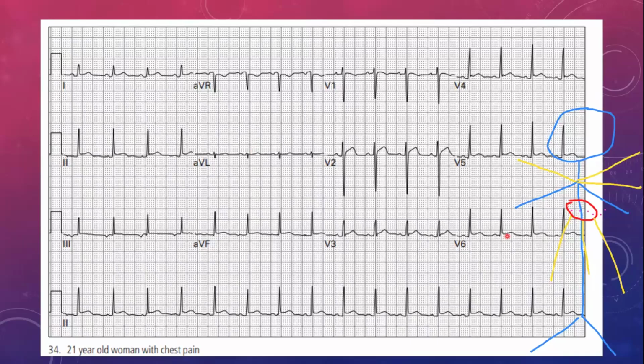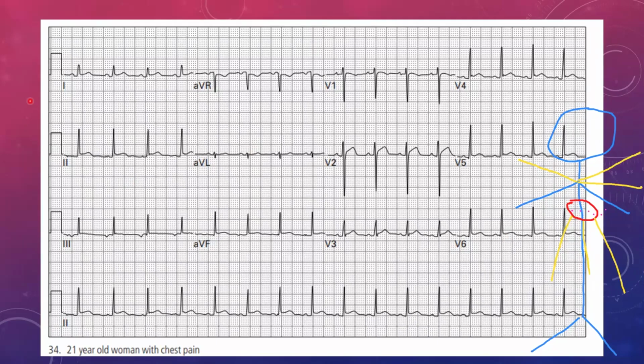Any ideas on what could be going on or what the possibility may be? It's okay if you don't. I'm just saying, if anybody wants to venture a guess, because now you're sitting with this patient, she's obviously in a lot of discomfort, she's not feeling well, and you have picked up ST elevations without reciprocal changes. So there's a few possibilities when you see this pattern, all right? So the first one is that, yes, this may be a massive infarction. It may be an infarction that's spread throughout the heart, involving every single zone, and is showing up on the ECG. So that's definitely one possibility.